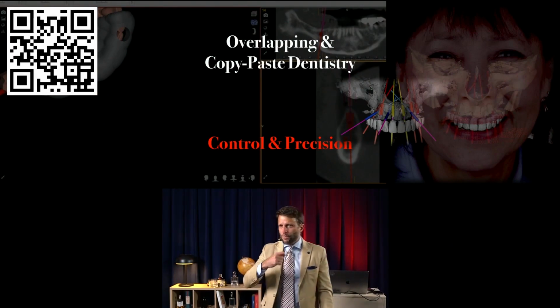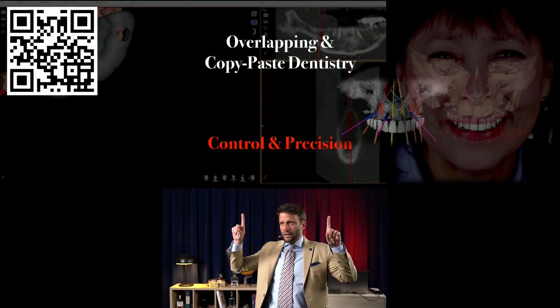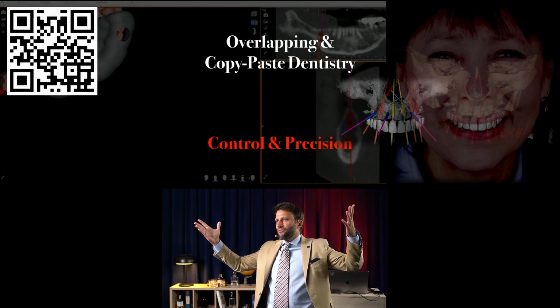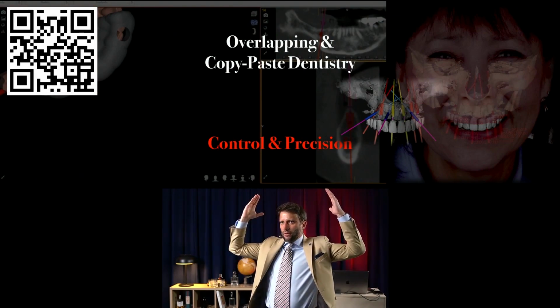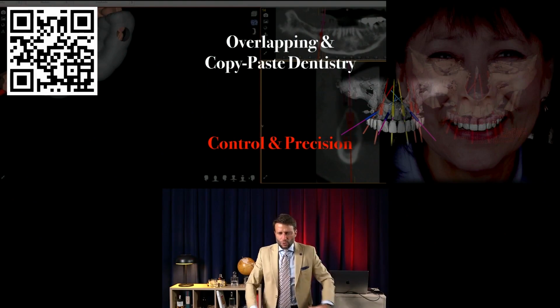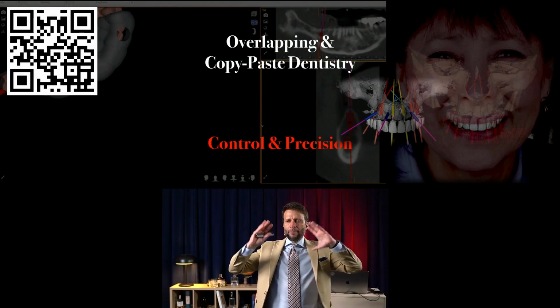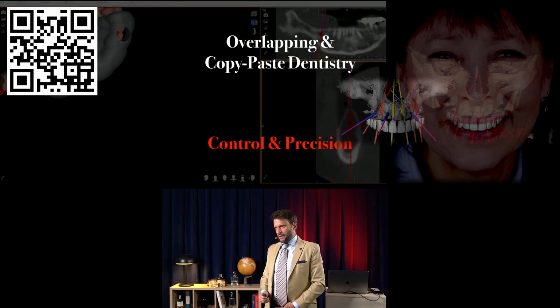We get many times those pre-op scans like the alginate impression. It was the same problem with alginate, huh? In the lab, we used to have that problem. Alginate impressions that are almost not even getting the cervical of the teeth, that don't even get the gum properly, that don't get the vestibule. And then you have those amazing alginate impressions that are getting everything. This is what we need with the scans. We need to grab all the information. So make sure that you scan the gum, you go high, you scan the tuberosity, you scan the palatal side.